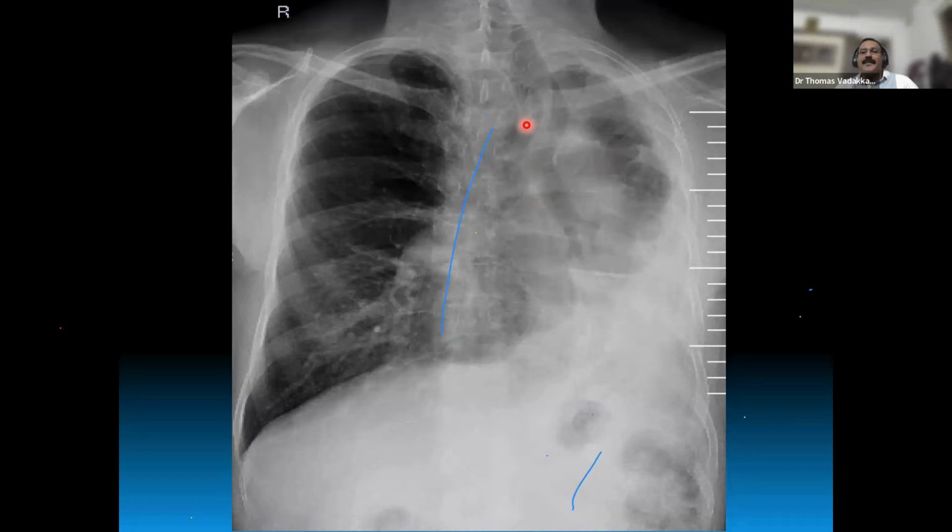Yes, right? Lung herniation. Yeah, this is actually, you assess step by step. This is the trachea. You can see the trachea is occupying the left hemithorax, and you can see the pleural thickening over here. The ribs are crowded over here, and practically there is no lung tissue on the left side. All these are occupied by the right lung, right lung herniation. That's why the cardiac shadow is not seen. Cardiac shadow is shifted towards the left side. Left hemithorax has shrunken, and the left lung has been replaced by fibrothorax.